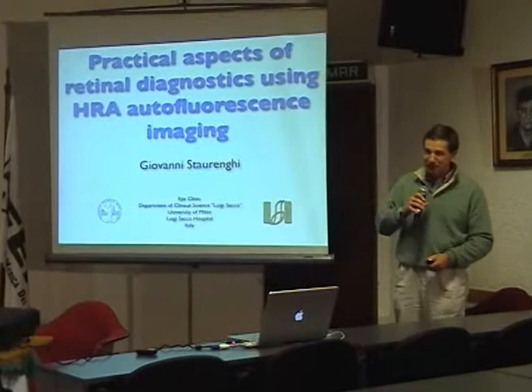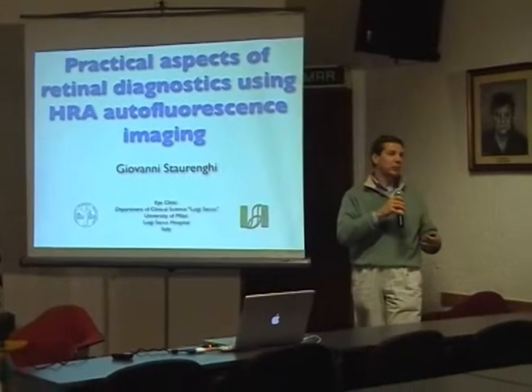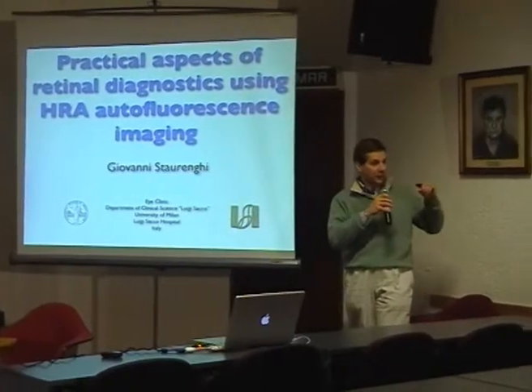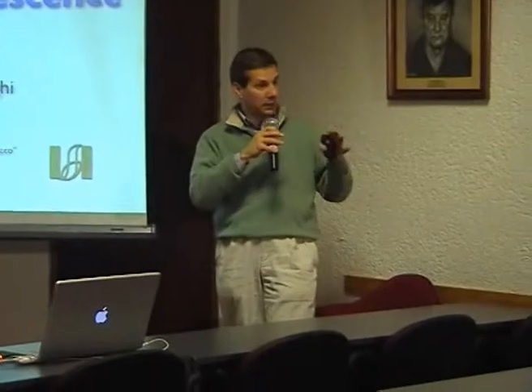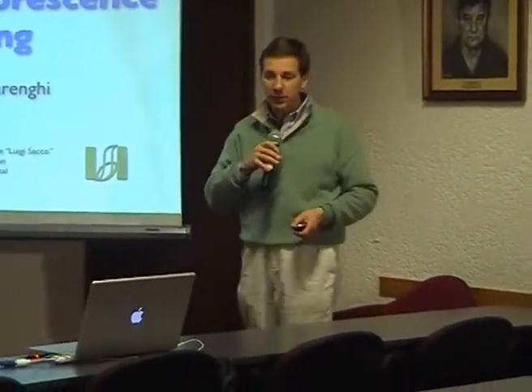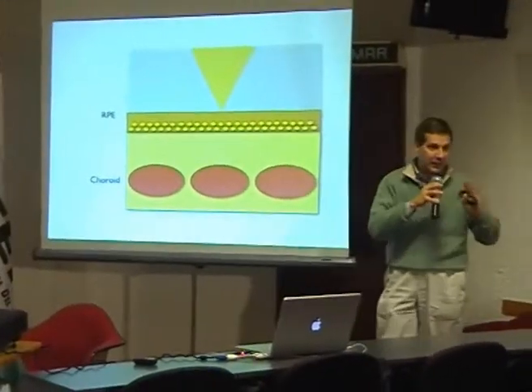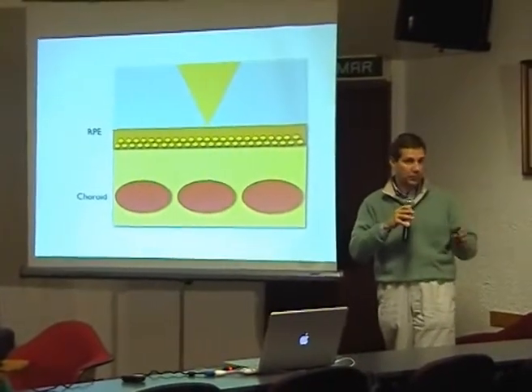So, autofluorescence is a new tool for knowing the situation of the retinal pigment epithelium cells. And it's easy to take, it's not invasive, as you heard just now. And I will try to show you all the possibilities that you can have when you deal with autofluorescence. Please, at any moment, you can interrupt me, and if I have to clarify, let me know.